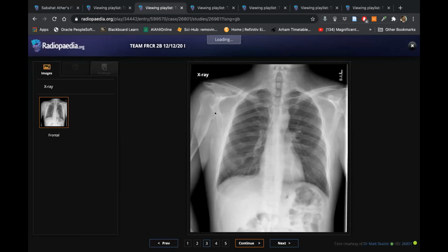There is surrounding increased soft tissue, and the visualized chest and other bones appear to be normal. I cannot see any obvious soft tissue. There is no soft tissue, just broadening of the bone, and there is some cortical irregularity also.